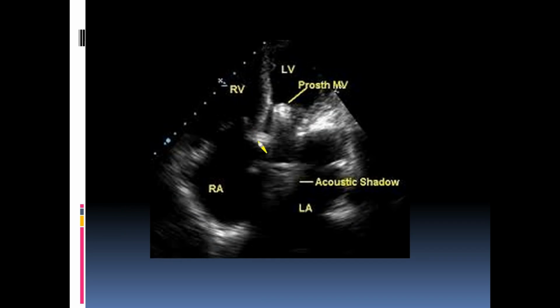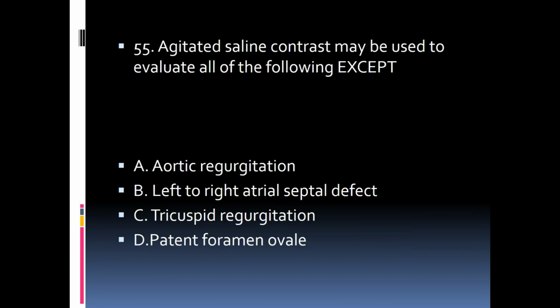As you can see, there is a prosthetic valve at the location of the mitral valve. In the image, because it is a strong reflector, it appears as a highly echogenic structure. You can also see that there is dark shadowing behind it. When shadowing like this occurs, there can be various limitations in identifying regurgitation occurring behind it. So, you can think of this as the kind of question that asks about these aspects. In short, just remember that shadowing is a representative artifact that can occur with prosthetic valves. Let's move on and look at the next question.